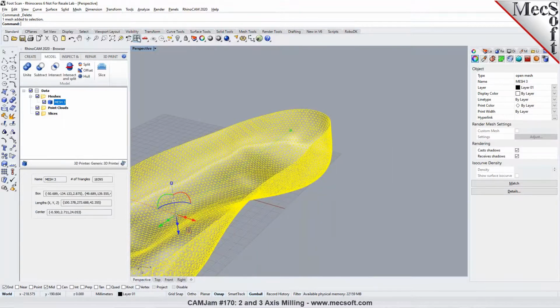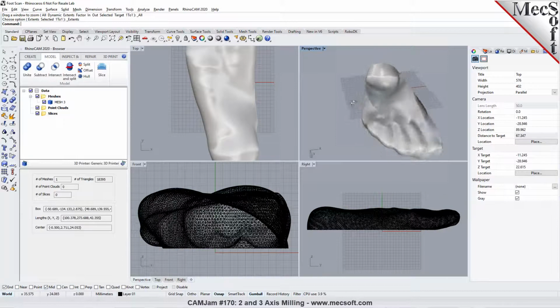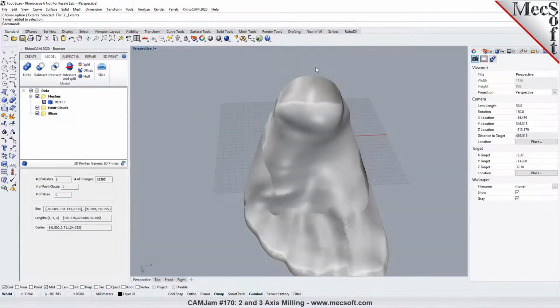And now if I wanted to modify a certain section in here, you'll have to again split it and modify it. You've got to use the tools. There are also some third-party plugins available for Rhino that could be specialized for orthotics, so you may have to investigate that. There are plugins available for Rhino as well. Here I can do an offset of this open mesh in Rhino.